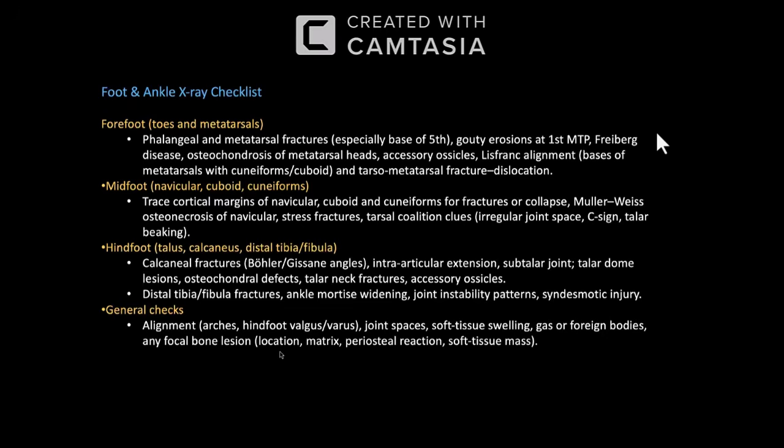If you are confronted with a tumor, look at the location, matrix, periosteal reaction, and soft tissue mass.